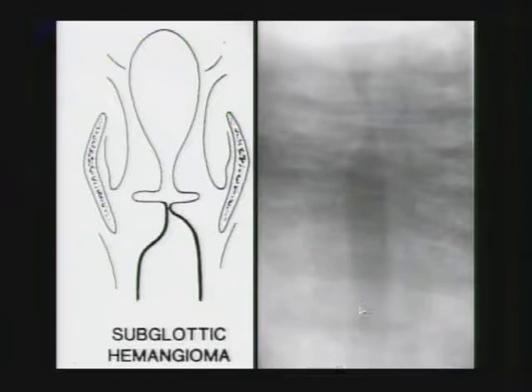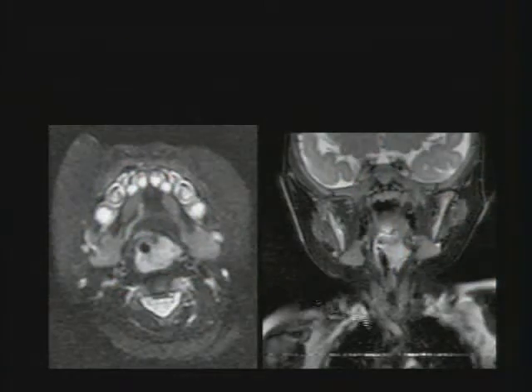And if you recall, our first unknown, here it is. This was the asymmetric narrowing of the subglottic trachea. Remember, unknown 1. Here on the CT scan, you can see the thyroid gland, the carotid artery, the jugular vein, and enhancement of this subglottic hemangioma and the tracheal narrowing, which is impressing on the right side. This is a color rendition. Sometimes we do a CT because it's quick and we don't want to sedate the child because they're having airway problems. This child required intubation.